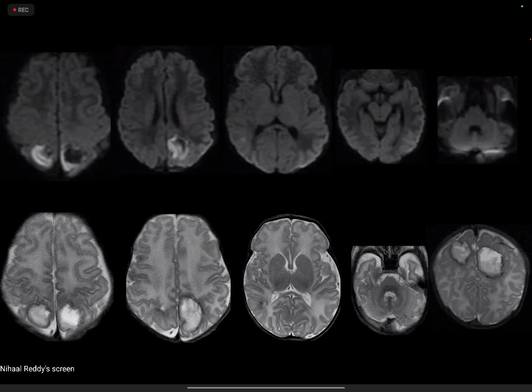But this has also ruptured the cortex, right? You've got some extraaxial material around there. It's not just within the brain parenchyma as such. It's not all intraaxial. But either way, as a child immunocompromised, are we using the imaging to diagnose fungal here, or is there a threshold for what it might be?